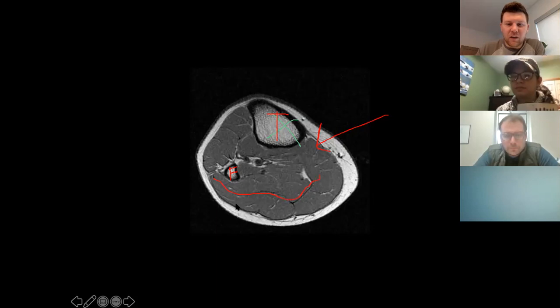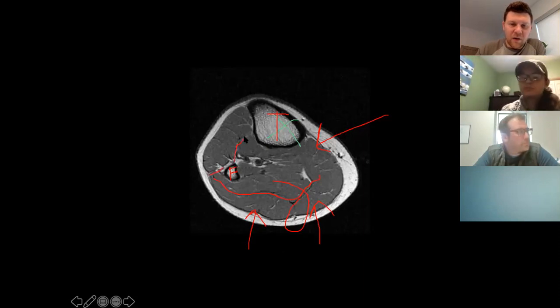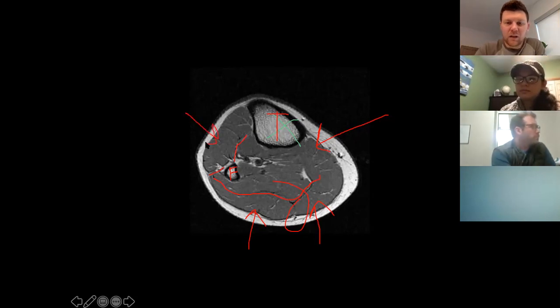we see muscles. What do you think the most posterior muscles are going to be? There's two of them. Good, gastroc-soleus. If you see the septa in the middle, we have our two heads of the gastroc, and we know those cross the knee joint, right? It gets a little more difficult to discern all these exact muscles in here. But what we do know in general is if we find these septa like this, we're going to see a compartment. What compartment would this one be?